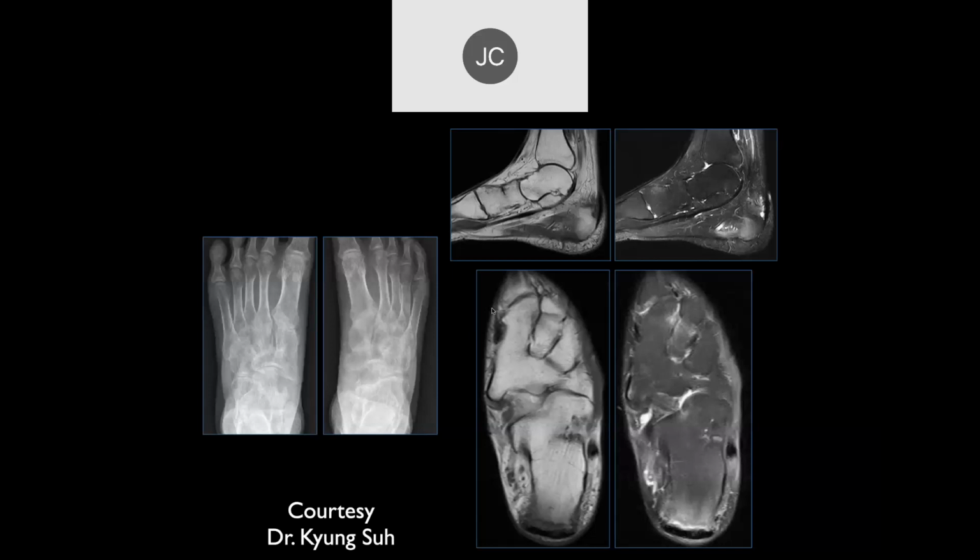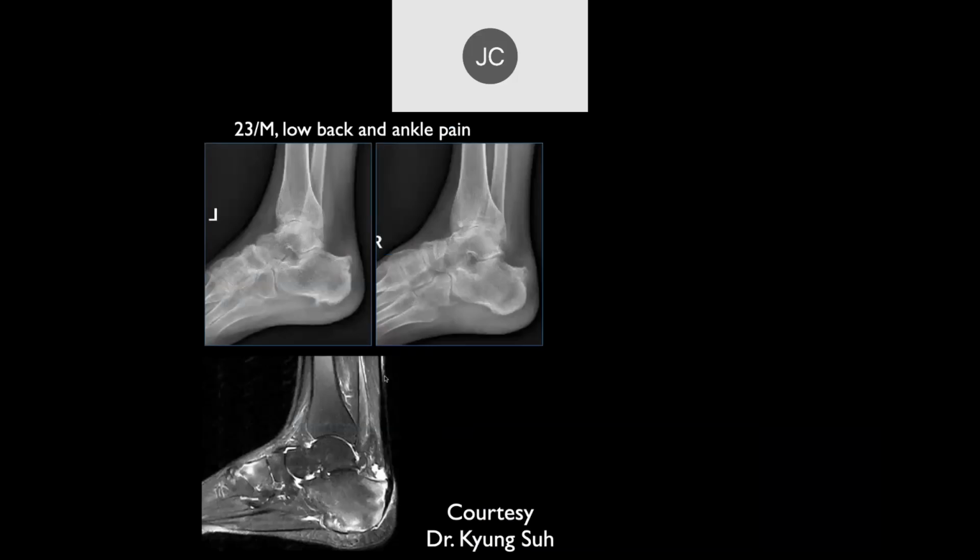So the patient has back pain, and we can see a lot of enthesitis here. So it could be rheumatoid arthritis, but there are other things that are more commonly or primarily associated with the insertion of tendons and ligaments like this.